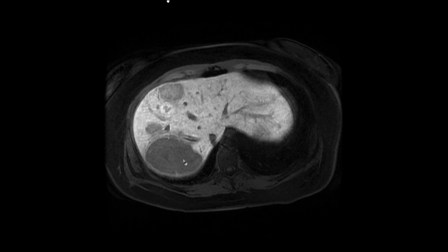If the patient especially is on oral contraceptive pills, which is a risk factor for these, they can stop the OCP and follow it up shortly and see if they reduce in size. But again, that's well beyond the scope of this talk. I just wanted to show you an example of one abnormal MRI and how we can look at all these sequences to try to determine what we're looking at. We'll talk about the specifics later.